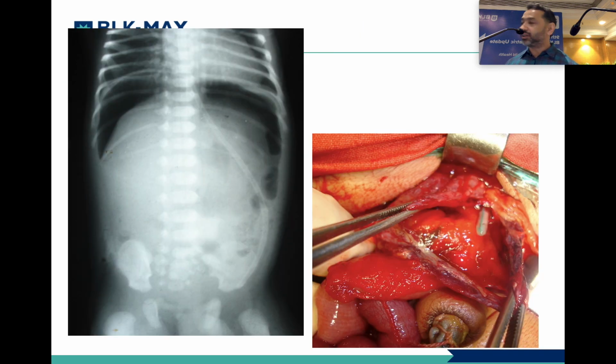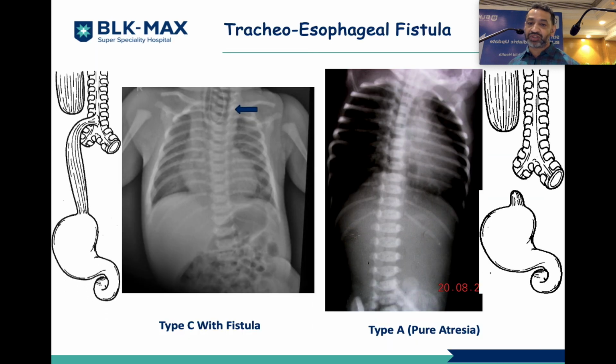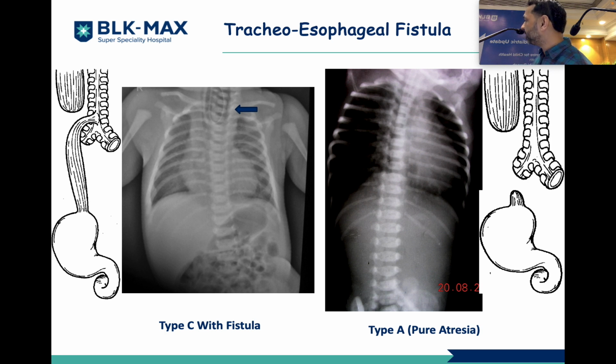This is a very classical finding of gas under the diaphragm, gas seen below both domes of the diaphragm in patients with stomach perforation.